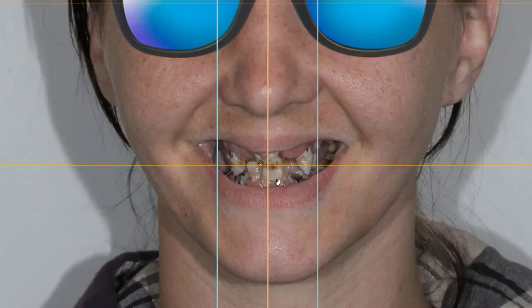Perhaps we could bring up her incisal edge just a little bit. I'm also taking away from this that her facial midline is off with her dental midline, so we can easily correct that. And then I'm also looking at her canines, and those seem to maybe be a hair long.